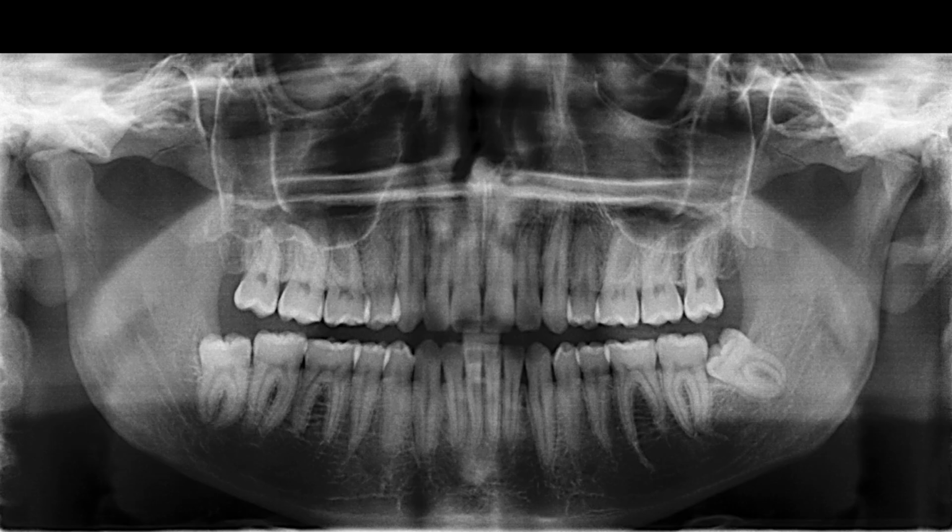So we take the x-ray, and then when you look at the x-ray, you can measure that 5 millimeter ball bearing, and then from there you can measure the tooth or whatever you're trying to do, and use that as a reference size to figure out how much space you have there. Again, nowadays that's a little bit more of an older technique. Nowadays with the digital CBCTs, the computer can figure all that out from the data that it picks up.